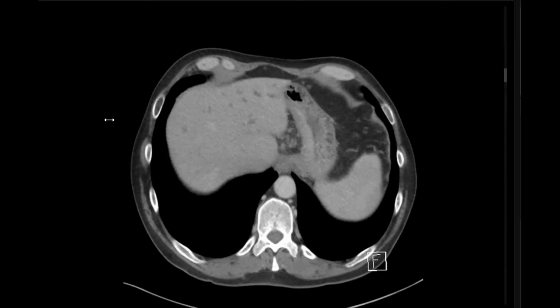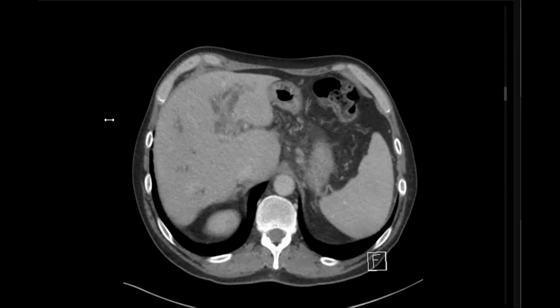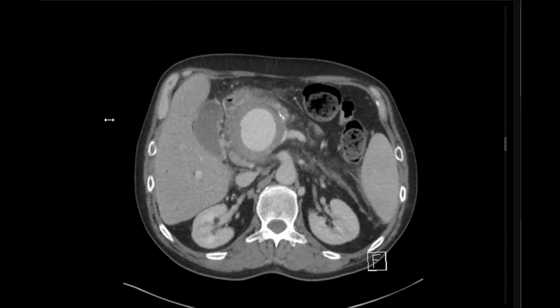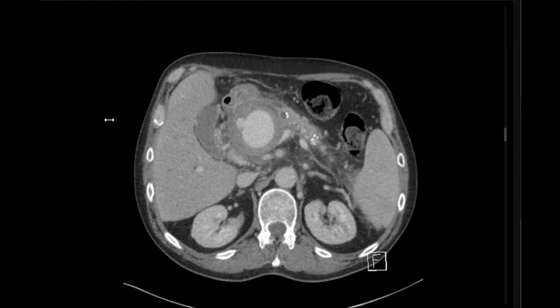Of which artery? Sir, I'm looking here. What are the commonest sites for pseudoaneurysm complicating pancreatitis? Pseudoaneurysm of the hepatic artery, or splenic, or inferior pancreaticoduodenal, splenic and gastroduodenal. Gastroduodenal. Sorry. Trace this artery.